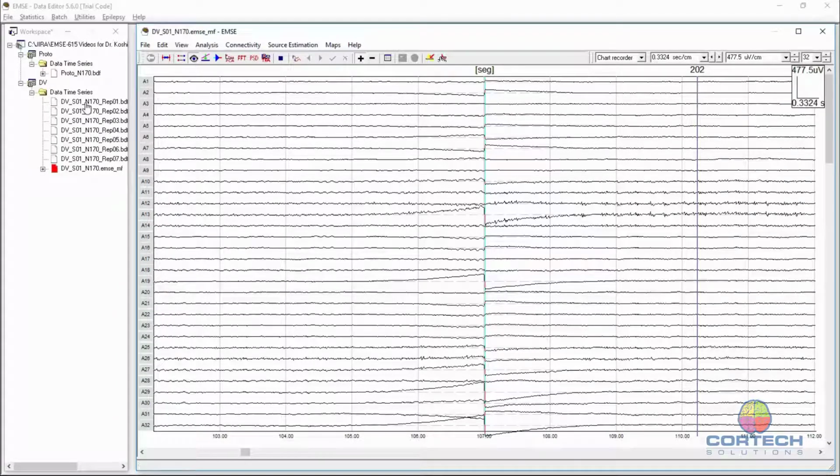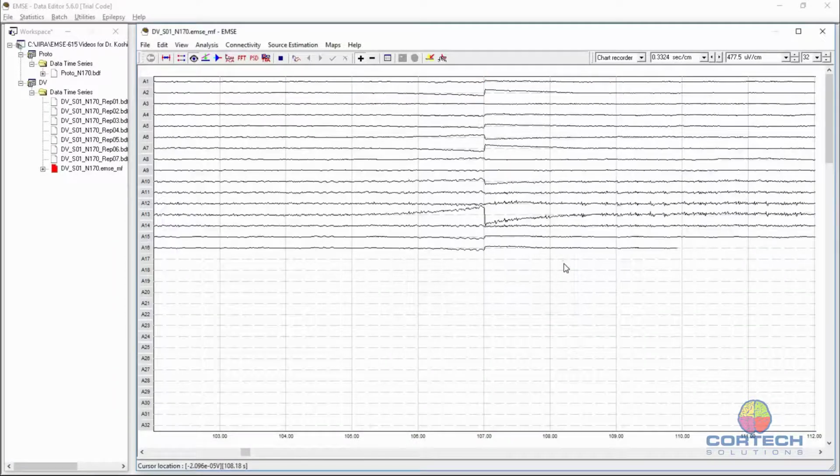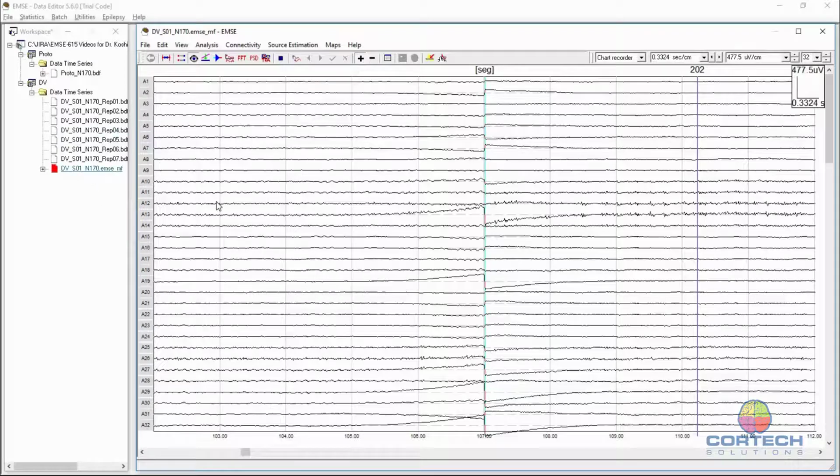the data. That is between the first replication and the second one, and you can see there's a discontinuity there. So indeed our meta file is concatenating all of these, and we can see that the filter pipeline contains exactly what we had in the prototype. So all of those filters now are being applied to all of these data files via the meta file. Okay, so that's our first step.